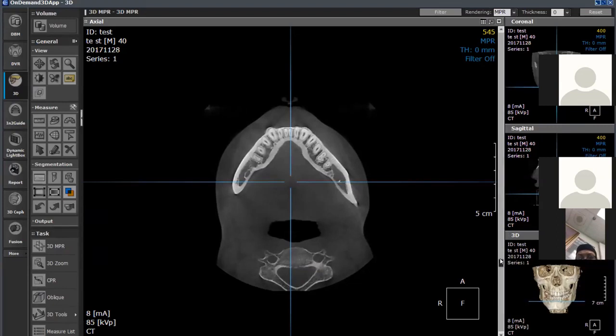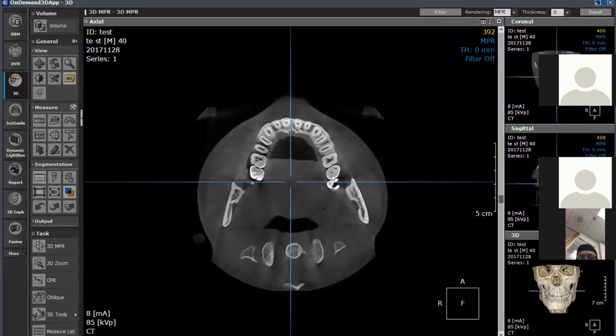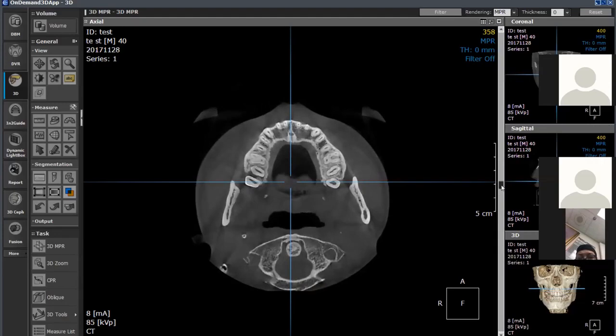If you go up to the maxilla, which I'll move up this way, same thing: we're able to evaluate the teeth themselves and move our way down through. We can actually see in this case that this one splits into 1, 2, 3, 4 roots. Again, that gives you the ability to predict what you're going to get into before you get into it. Moving around that, I'll go back and bring this back to our original screen here.